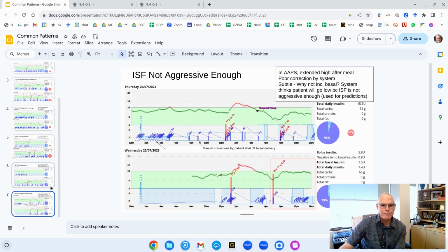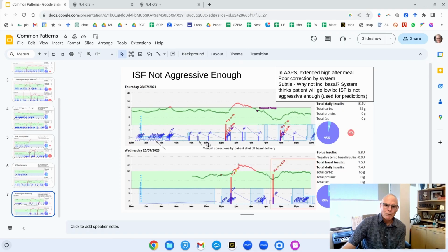And our final slide is also somewhat ambiguous and contentious amongst the 2 diabetes technologists and our visiting senior fellow Kate Hawke from Australia. Let's start with the big picture. What do we see on the screen? We see a bit of a high after lunch 2 days in a row. Are we getting excited by that?